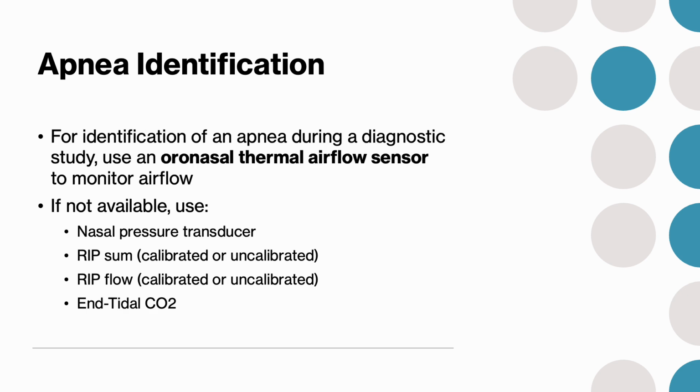Like I just mentioned, apneas are scored using a thermistor. If it just so happens that the thermistor has fallen off or stops working, or you don't have one, the time spent fixing it can be scored using the nasal pressure transducer. You can also score apneas based on the airflow signal that end-tidal capnographs show. If all else fails, you can detect apneas with the belts.